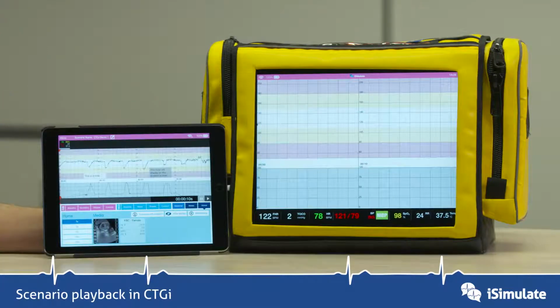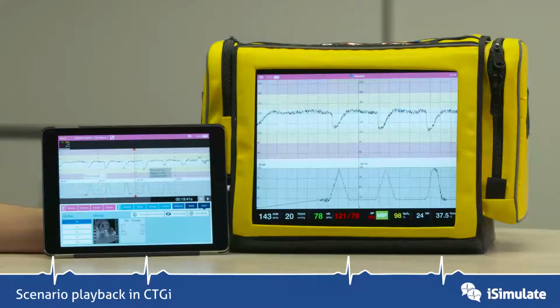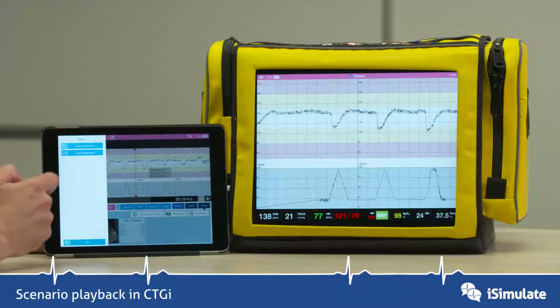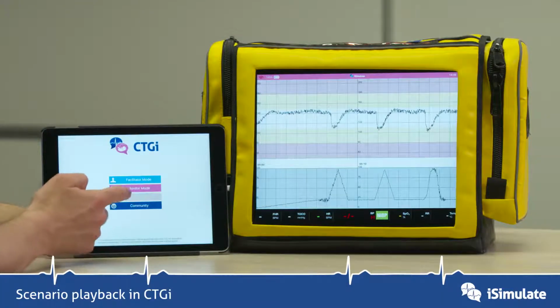You can hear that fetal heart rate, and as we've seen before, you can adjust the speed of that by adjusting the between 2 and 20 times. Of course we lose the sound, so we'll go back to 1 times to play that sound again. And we can move the orange marker along the trace, and we can see that trace appear on the screen. But it's running at a certain speed with a certain grid behind it, so let's see if we can adjust that. We're going to go Menu, Exit, and now we're going to go into the settings.